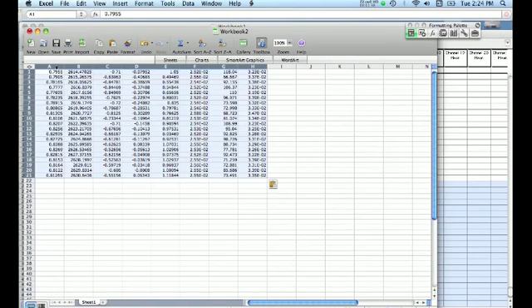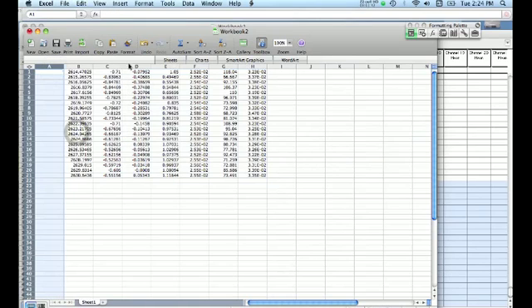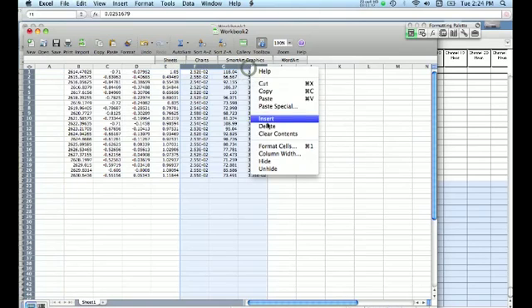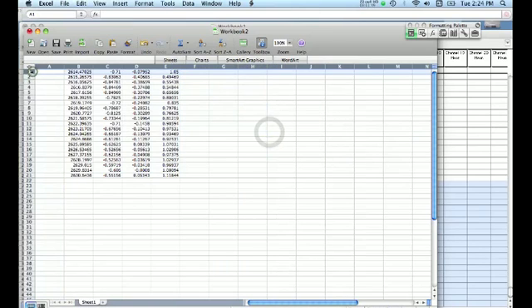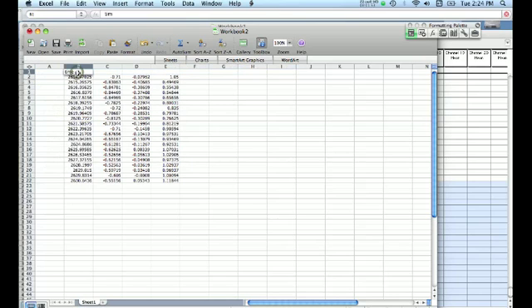So the useful information from this particular file, I'll just label everything properly for you. This is time. This is the minimum tonometer value. This is the mean tonometer value.